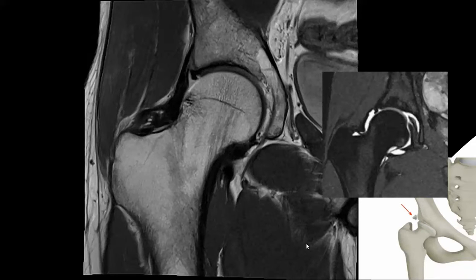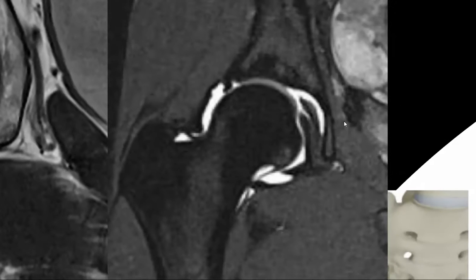The other type of sequence we have as a mandatory sequence in MRI imaging is the fat suppressed imaging. Now here it is on the right hand side. This is where the fat is suppressed, so unlike the T1 weighted imaging, the fat suppressed imaging is more sensitive for fluid. Because fat is suppressed, it's dark, so you can see the dark marrow fat is suppressed, the subcutaneous fat is suppressed. You've still got a little bit of brightness here, which is where the red marrow is, because it has less fat. And in addition, this is what we call an arthrogram.